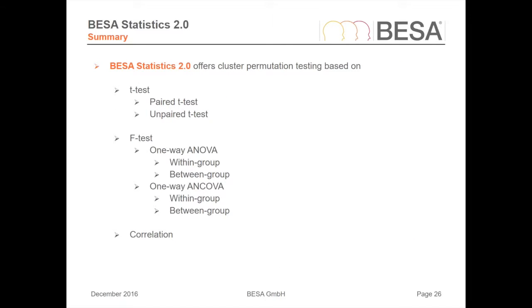This leads me to the end of the overview of what BESA Statistics does. All tests in BESA Statistics use the cluster permutation testing approach, and let's now have a look at this in practice.